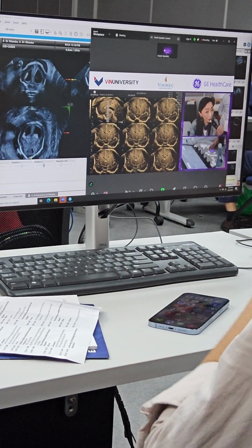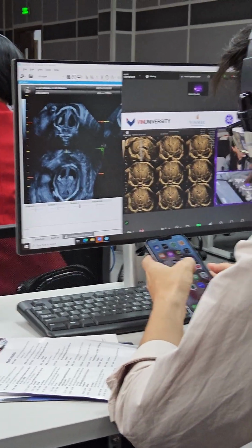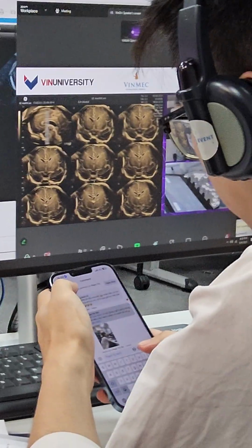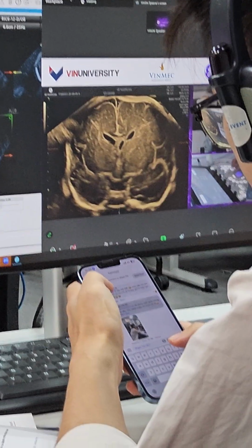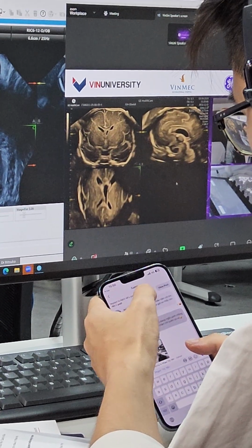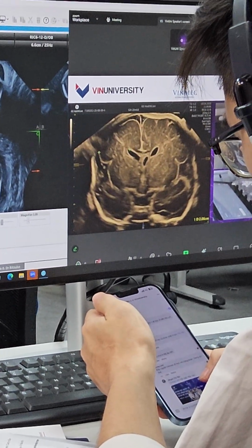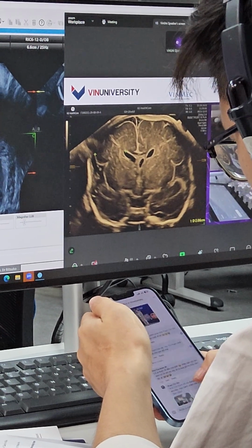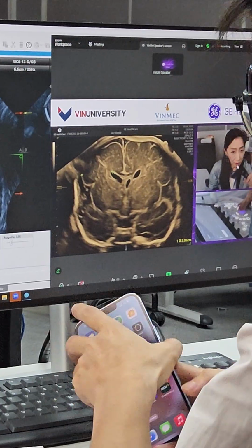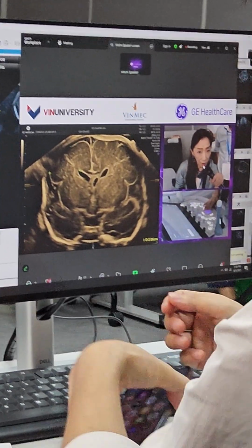For example, this is almost the symmetrical structure, and then we can measure. For example, it is very easy. For example, here to here. Okay. And here to here. Look at this. This is completely 2.85 versus 3.36.